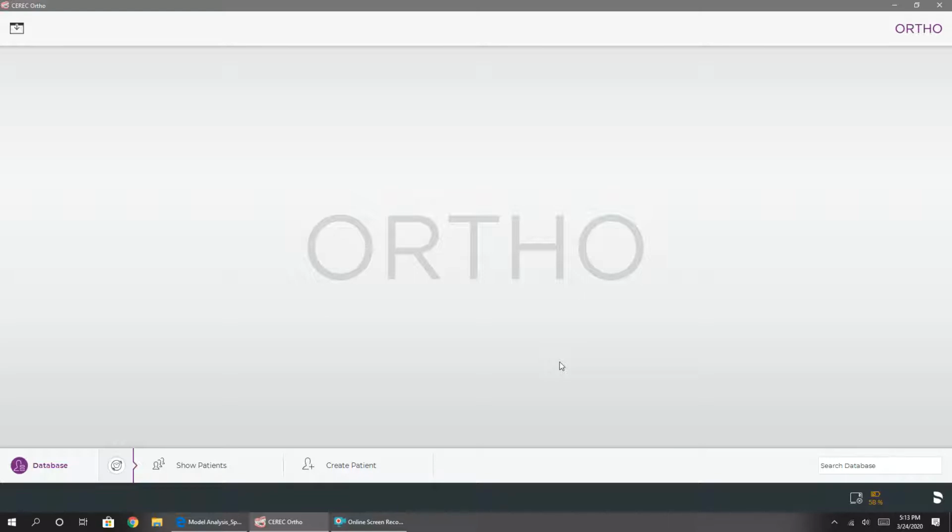As some of you may be familiar with, back in our Omnicam days, we did have an orthodontic software module available with the Omnicam. It was a guided scan process and was a very technique-sensitive software, which to say the least, left a little bit to be desired as far as workflow and usability.